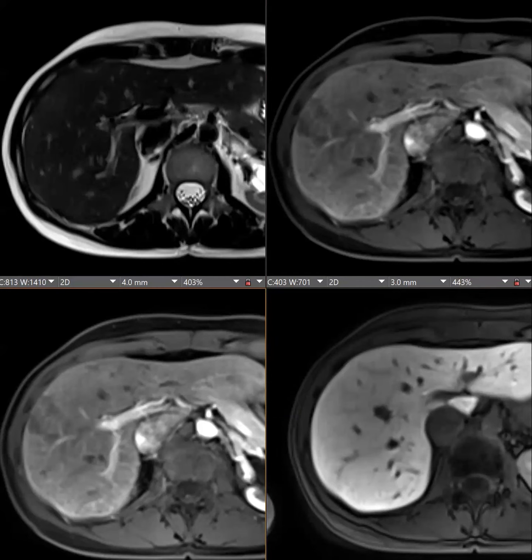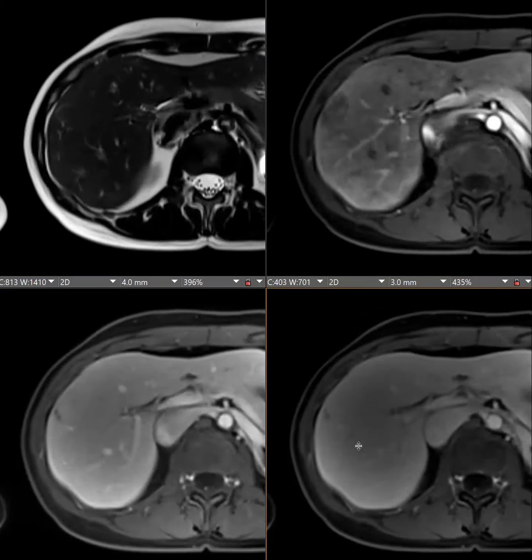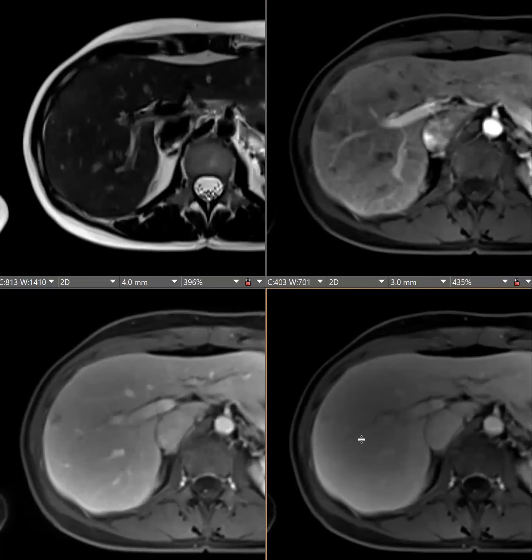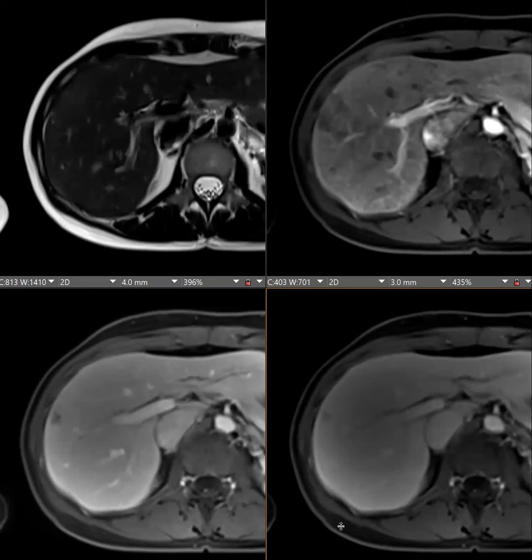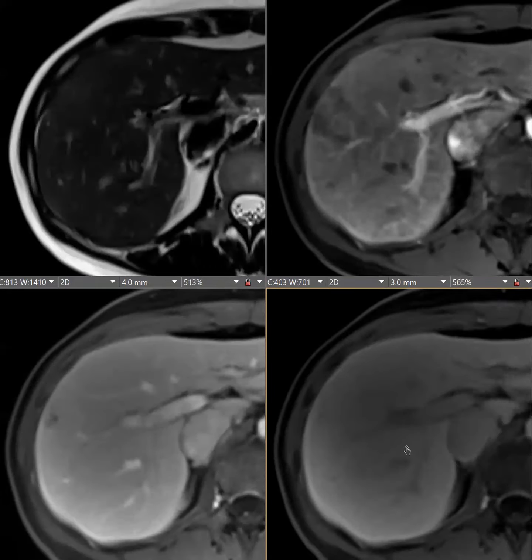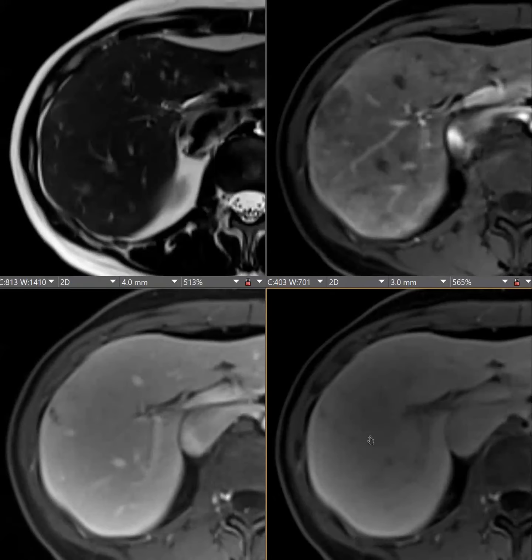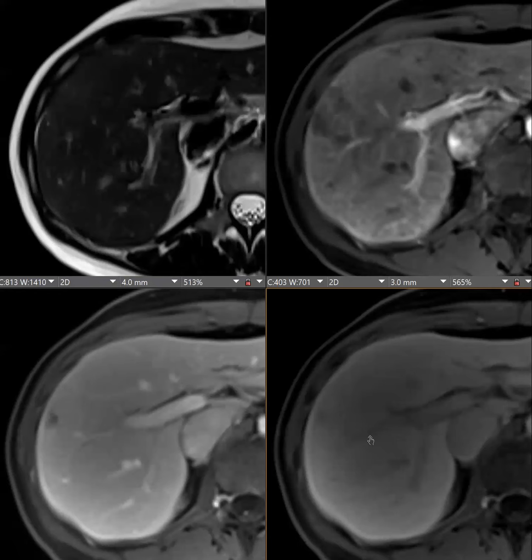So let me move this one, arterial there, and I'll give you 60 seconds and 2.5 minutes. So it goes from the inside out, and then the 5 minutes is here. So I don't really think... I mean, I think I would have just called that delayed enhancement. It's not as well defined. Yeah, I would have called it prospectively centrifugal.